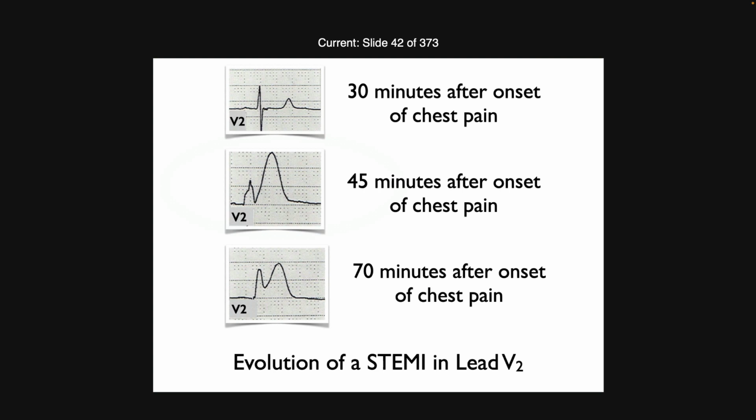It pops it out. In my experience, and we're going to see some pre-hospital 12 leads where people were transporting, especially if you're doing serial ones where you're looking for the change, going down the road doesn't prevent you from getting a good picture of what's happening. Bumpy road, yes.